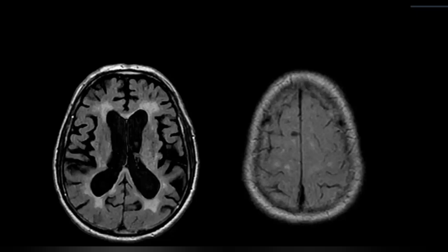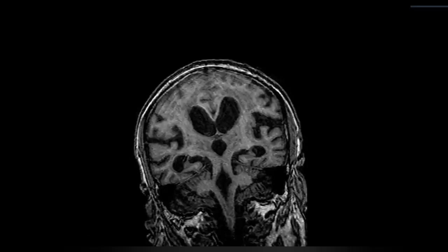What do you think the diagnosis is? So if I consider this volume loss and these periventricular hyperintensities, then this could be ischemic changes, as in old patients, or microvascular ischemic changes. Other possibilities, if the patient is on chemotherapy, could be post-chemotherapy leukoencephalopathy. So you think there is a volume loss and the patient has some white matter changes. Yes. One more image. Is that helpful? It's a T1 coronal.